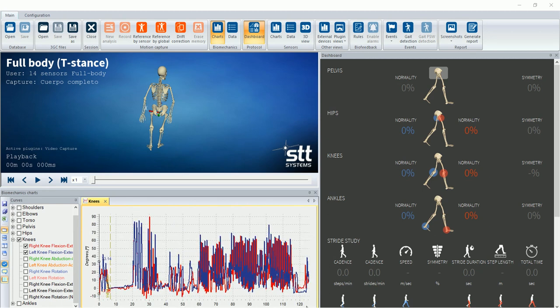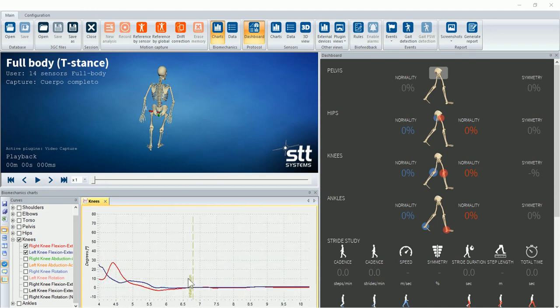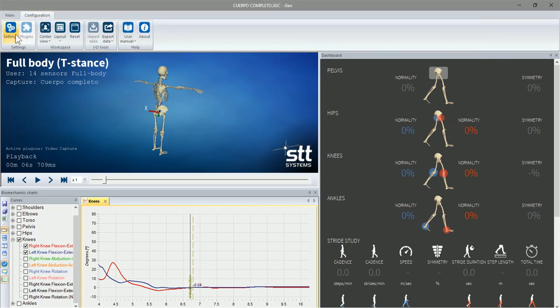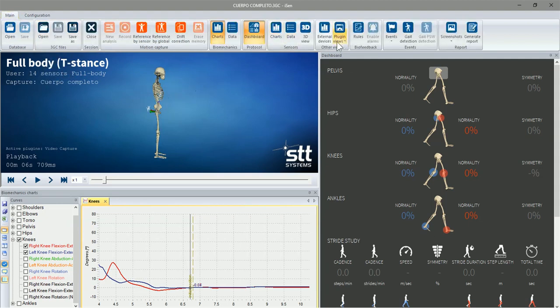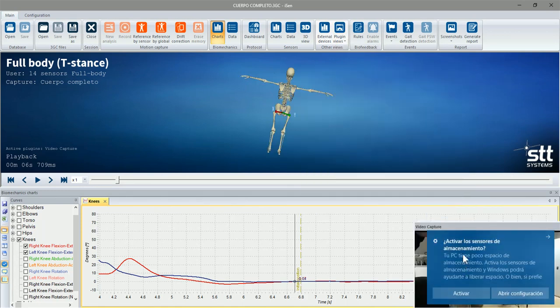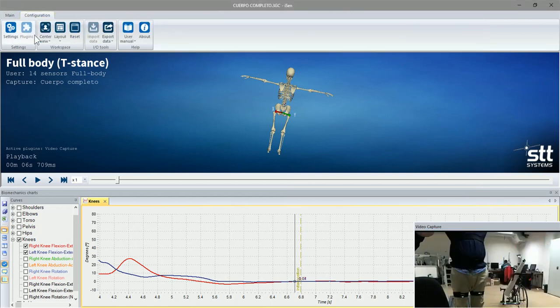This one is a longer recording, around 2 minutes. Let me go to where the initial position was taken, which is right here. I will choose a more convenient point of view, in this case, for example, the right. Oh, let me check if there was a video here. I think there was. This one has a video. Plugin views. Exactly. This is the one with video. Skip. Okay. Right view. Very good.